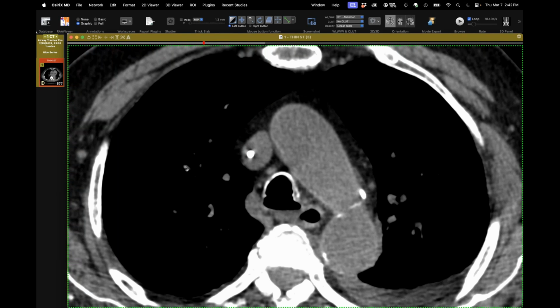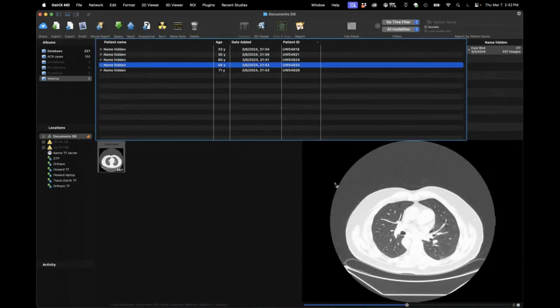If you look on CTs, if you scroll through them and look at the airways, you'll see these broad-based, flat little bumps right on the rings. And I remember early on, I did some virtual bronchoscopies just to prove that they were actually on the rings. And then you can see the membranous insertion is right here, and that's why it kind of flares out like that. But this was kind of just a cute case. This is a fun case.